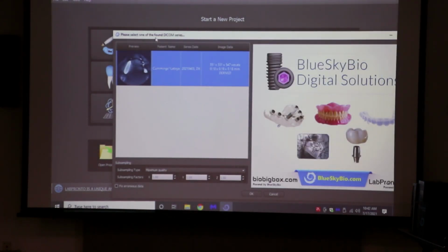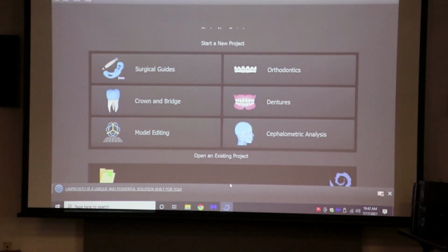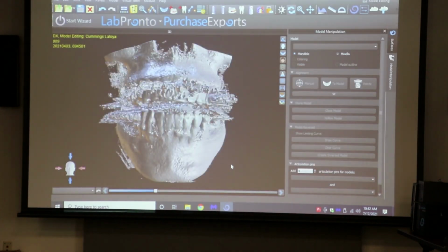It's going to say they found the DICOM, try to use for stitching points. Just the defaults. So what will we bring in? Is it just the CBCT? Yeah. All right. Is everybody here? Yeah. I assume I can do that, but you probably.